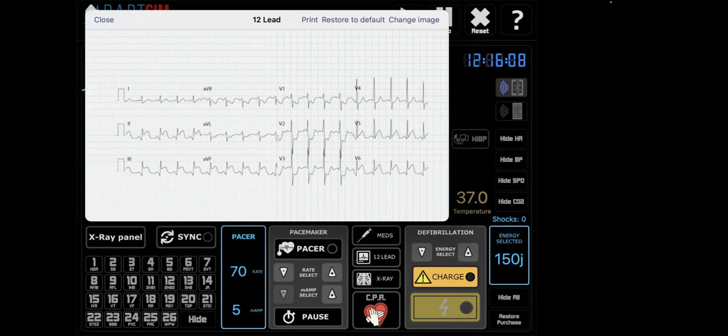And in this, I see there's ST elevation in lead 2, lead 3, and AVF. In this particular example, this is an inferior STEMI because these contiguous leads have ST elevation in them. If you haven't taken a 12-lead ECG course, it is offered through the New Brunswick Critical Care Nursing Program if that is something that interests you.